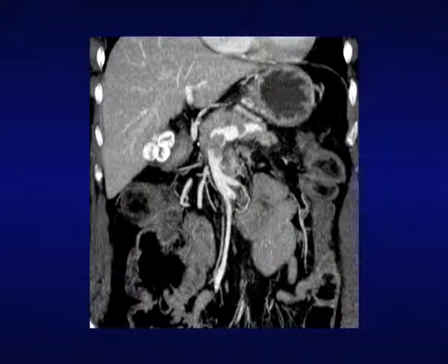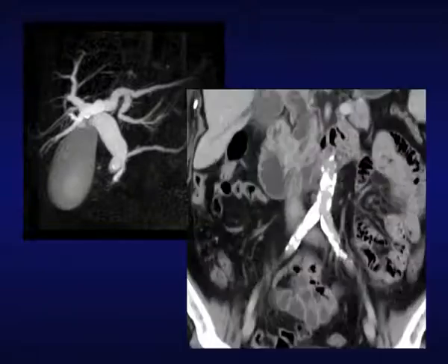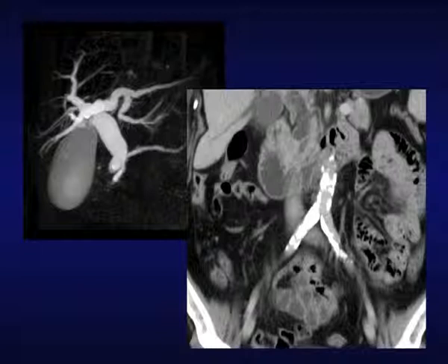But you see, this is a wonderful MR image. Enlargement of the biliary duct, enlargement of the Wirsung. Obviously, the cancer is here. This is the same scan, enlargement of the biliary tract, enlargement of the Wirsung, and here is a little cancer, grade 0.